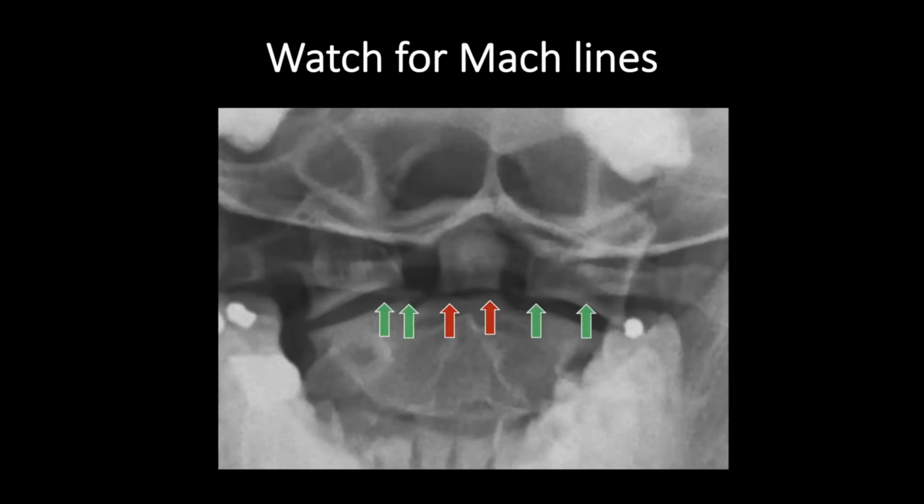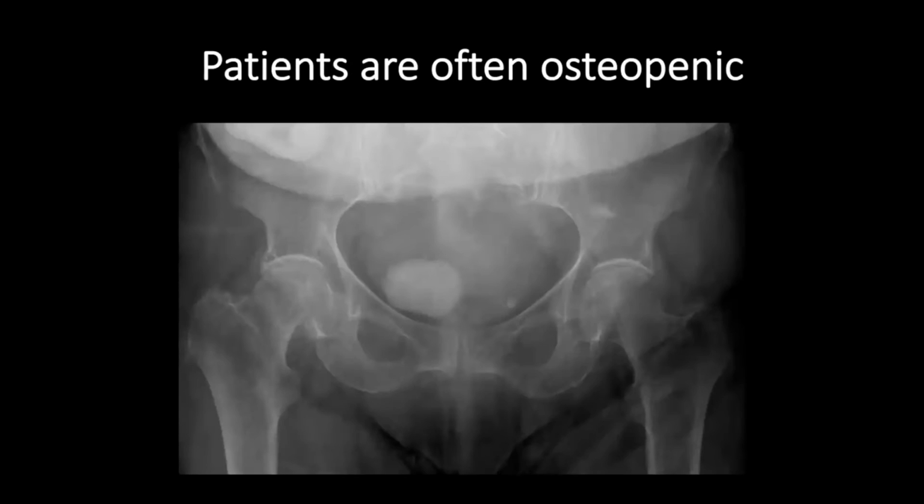And the way that you can sort of suss that out is you can see if you can trace out that line beyond the cortical borders, or does it stop right at one cortical border? If it stops at the border, it's more likely to be a break. But that's part of the problem when we have structures with a lot of overlying bone, like feet, wrists, etc. A lot of these subtle fractures can either get missed or blown off.